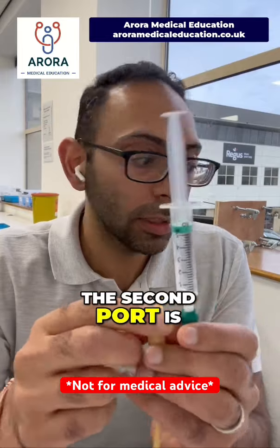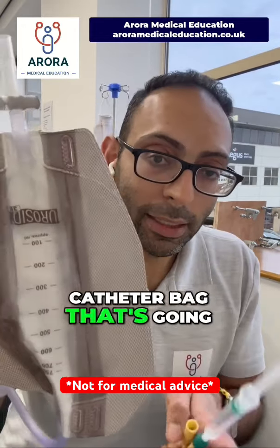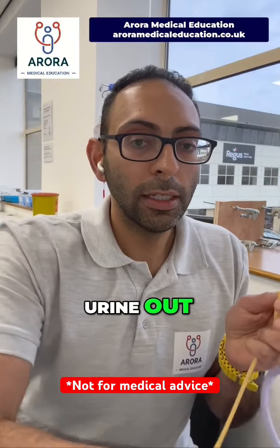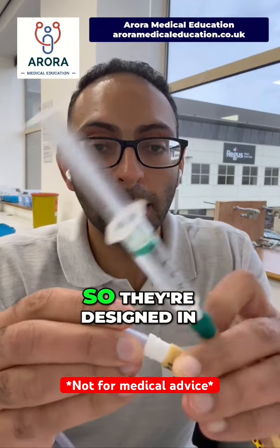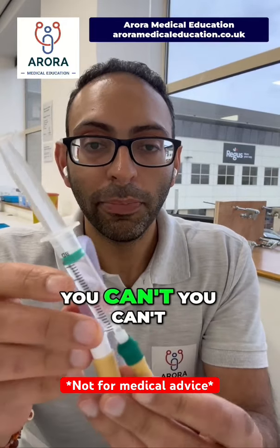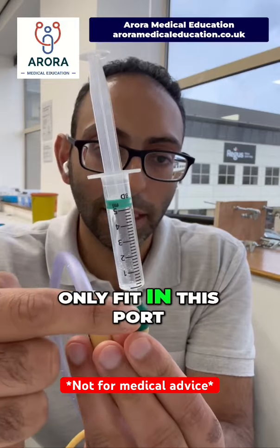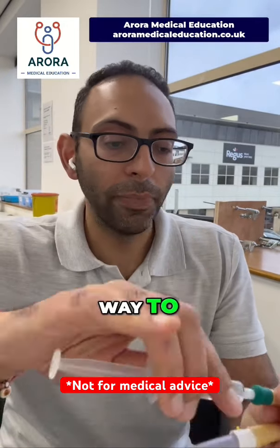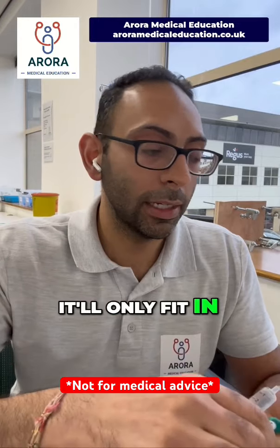The second port is to attach to the catheter bag that's going to drain all the urine out. So that will fit quite nicely, as you'll see here, in that port there. So they're designed in a way that's quite clever. You can't get these mixed up, because this will only fit in this port and the syringe will only fit in this port. It's just a nice way to take the pressure of having to remember which side or which color goes with it. For example, it'll only fit in one place.